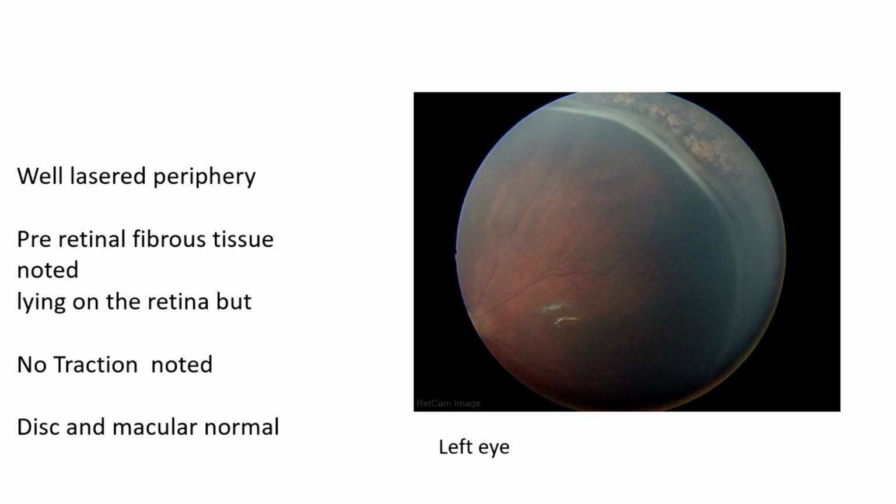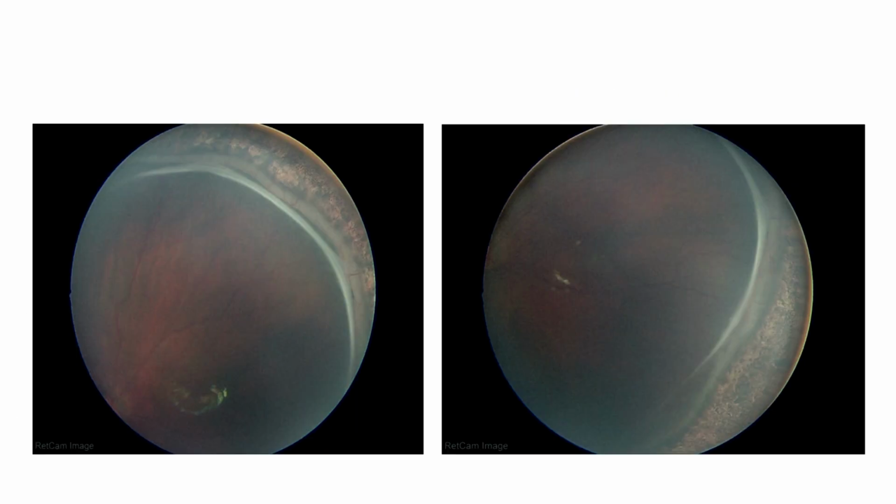Obviously, when you're looking at the child, you'll be able to see much better and gauge it as either elevated or not elevated. So in this two-dimensional picture, it's very difficult to say. But one important point is you can see the color of the tissue, and you can see the vessels behind it. Are the vessels elevated or tortuous, like Dr. VJP was alluding to in the previous eye? That will give you an idea whether it is elevated or not elevated, or pulled.